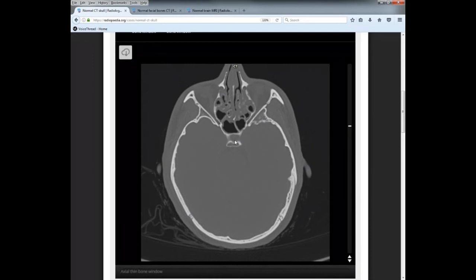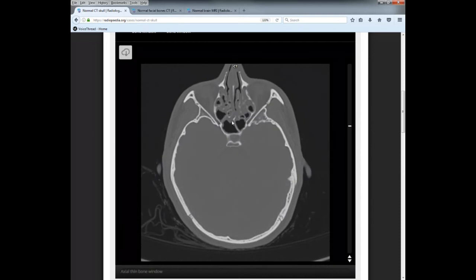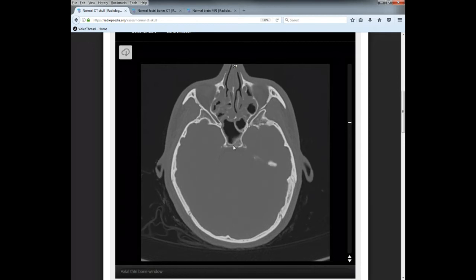Axial is probably the hardest to see of the sphenoid, but you know the sphenoid is just posterior to the ethmoid, okay. Look for this central guy here, your posterior clinoid process. As you travel down, it's going to join up and form this little seat, the sella turcica, and then the inferior portion, your dorsum sella, okay?